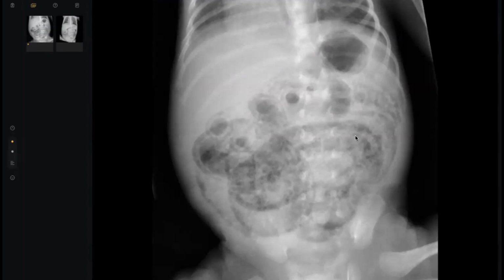I am provided with a frontal radiograph of the abdomen of a skeletally immature patient or an infant, showing multiple areas of lucency lining the wall of the bowel in the mid abdomen. There is also evidence of dilatation of the small bowel. I cannot appreciate any linear lucency projected over the liver.